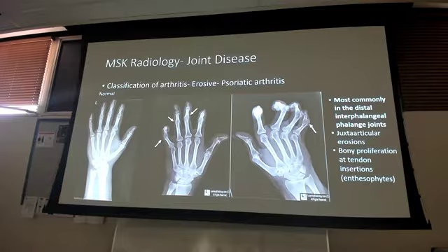What are the ones I know from that? I know psoriatic. Oh yeah, I also know that erosive hypertrophic one. Do I see Gull-wing deformities? No, not really, I don't. Okay, so maybe it's psoriatic, right?